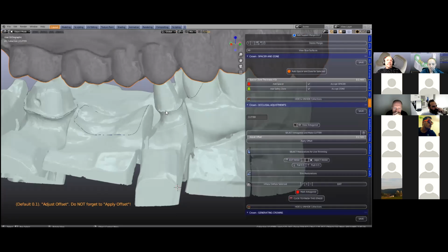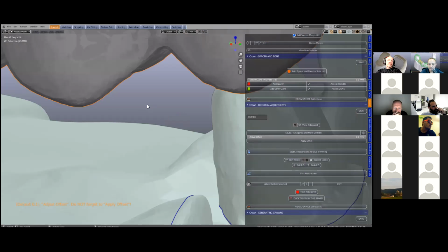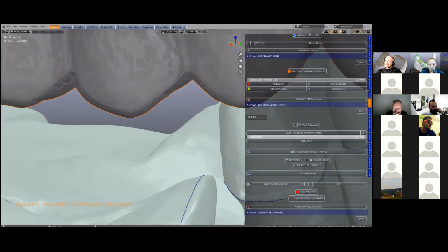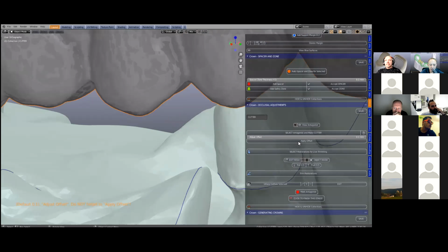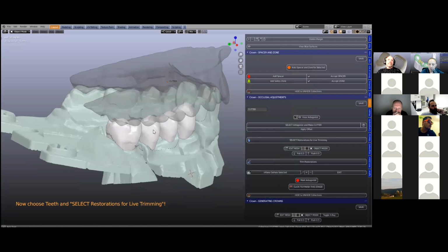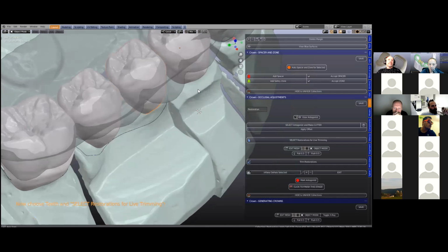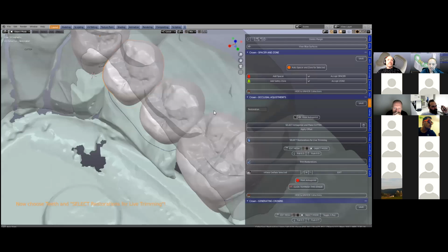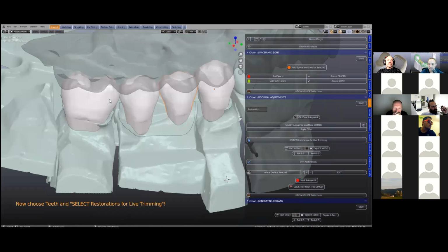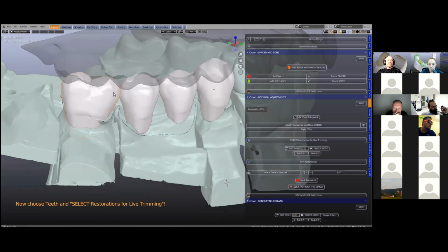In addition to that, we're going to offset it. It's making a duplicate cutting tool behind the scenes, which you can then expand outwards. Michael's just done that. By default, we have it set to 0.2 or 0.1. In our experience, we use 0.2. This is so that if your zirconia crowns or Emax crowns are continuously high in bite, you just need to change that offset. Making that cutting tool a little bit bigger will do the trick.